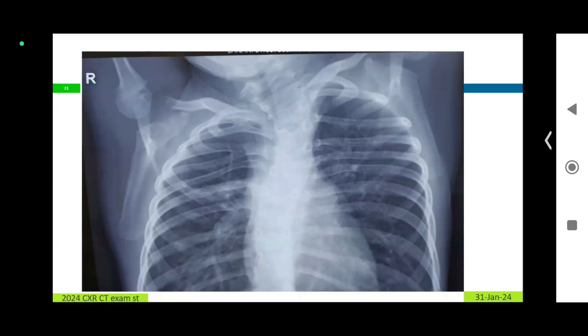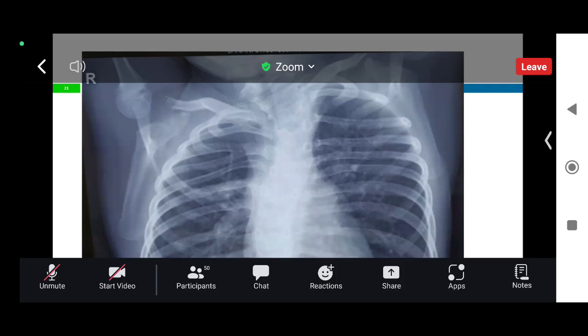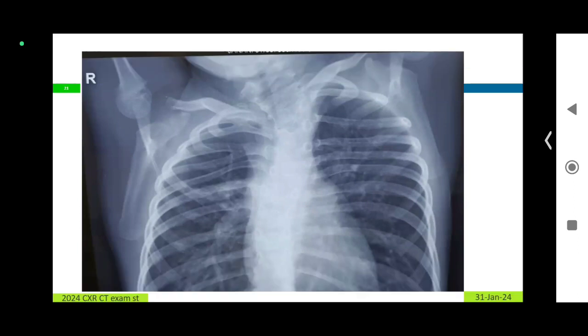Sometimes I do miss out a kyphosis or a scoliosis, but an X-ray tells me what I had missed in general exam, I see it in the X-ray, kyphosis, scoliosis. In these children, you may not be able to interpret the bronchovascular markings properly. Many a times you will think that this is a patch of pneumonia, wherein it is nothing but the bronchovascular markings on that side. So be careful when you interpret lung parenchymal shadows in a child who has got a kyphoscoliosis.